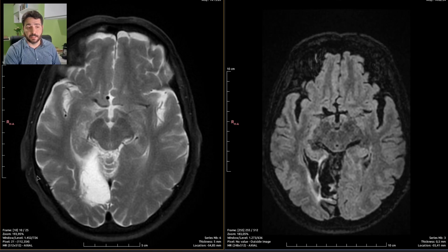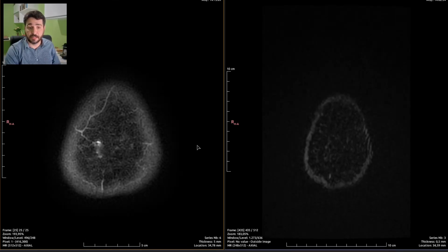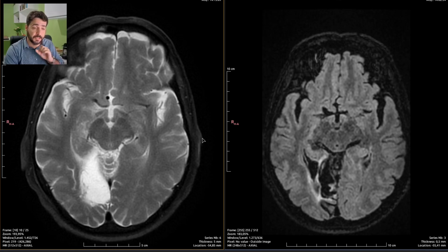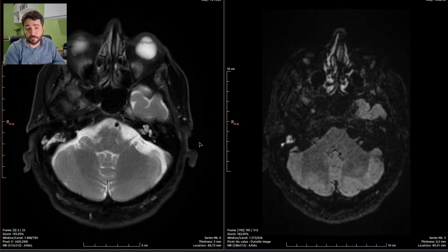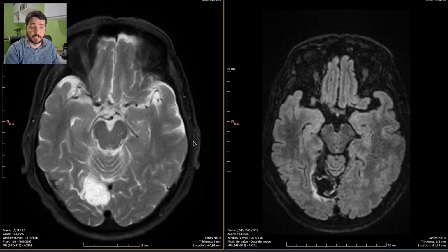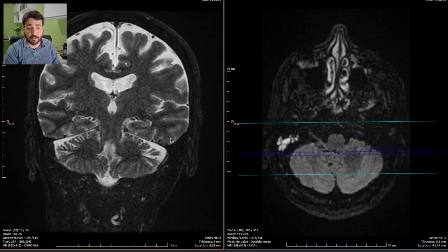They also added the fat suppression pulse to the sequence, which isn't needed. You only need one fat suppressed T2 weighted sequence on such an exam. But as I said earlier, I think this place has a very new and powerful MRI scanner, and they really don't care about exam times and exams taking too long to finish. So they should be making a lot of money.